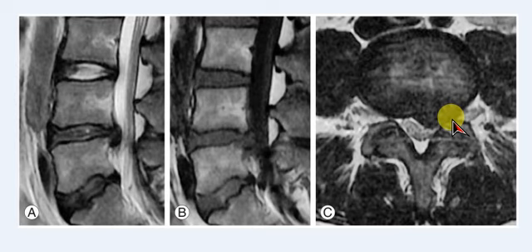The prognosis in this particular case will be poor. Of course, it depends on the type of therapy and the patient's compliance and so many other things, but we have to understand that this is very important, and this is how we read the MRI image.